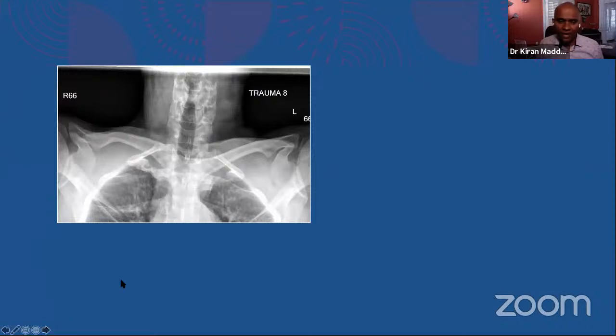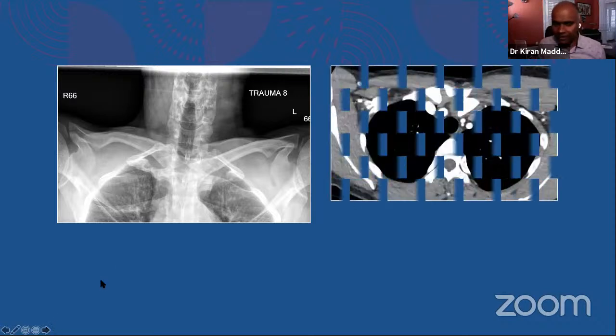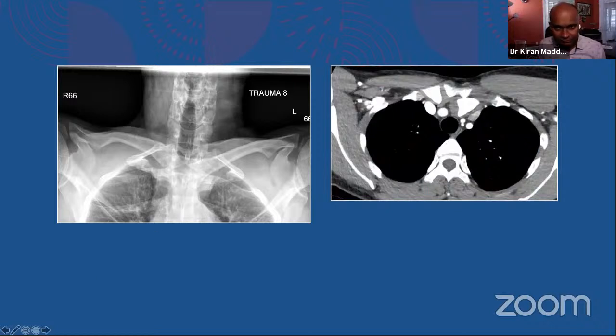And moving on to the last component of the chest radiographs, the musculoskeletal injury. I gave you the clue. So do you find any abnormality there? Anybody? This is going to be a little tough. So don't beat yourself up if you get it wrong. We are all here to learn, but we will be learning from some mistakes too. So don't hesitate to. Yeah, I know this is difficult for you guys. Anybody now? I gave you a CT.